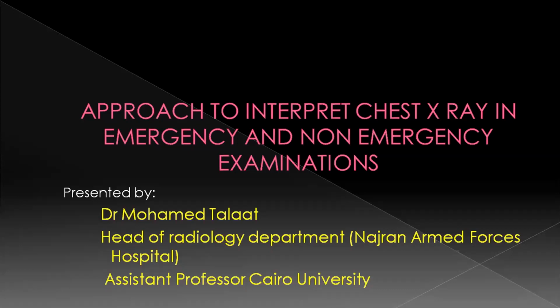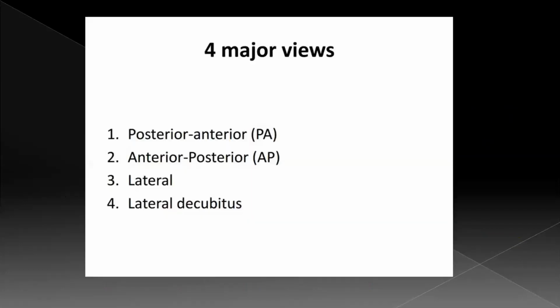So my recommendation is to have two points when you start to read chest X-ray. First point, you should have a checklist, and this is what we will do today. And second point, don't be satisfied by the lesion. If you pick up a lesion, don't be satisfied. Maybe there is another lesion, maybe there is another key to diagnose the lesion. So we can start with a brief introduction.